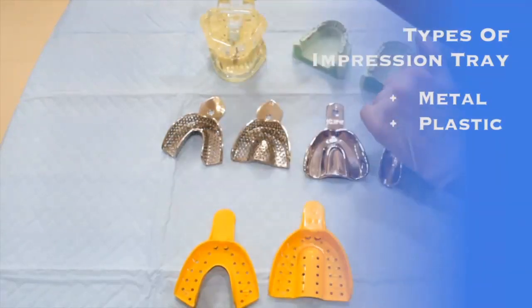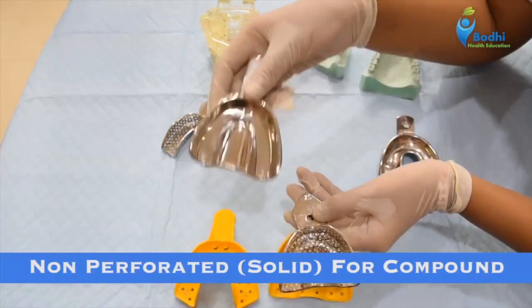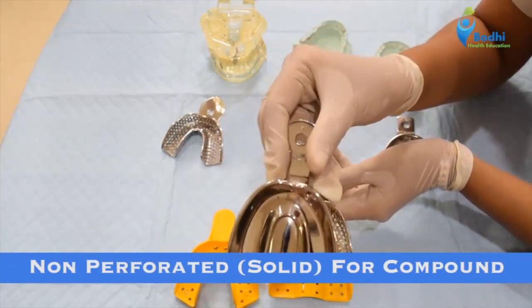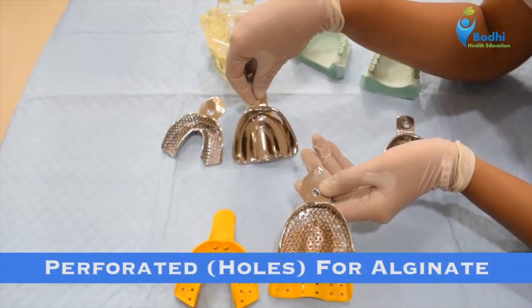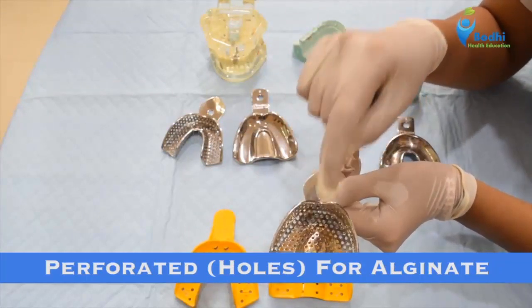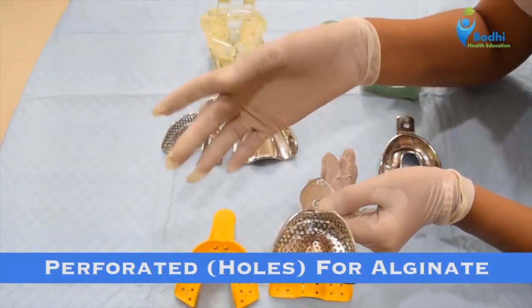Then there is another classification. Impression trays can be either perforated or non-perforated. This is a non-perforated solid impression tray. That means it has got no holes in it, if you can see. Whereas these are perforated impression trays. They have got small holes in them. There has to be some importance of these holes if present in the impression tray.